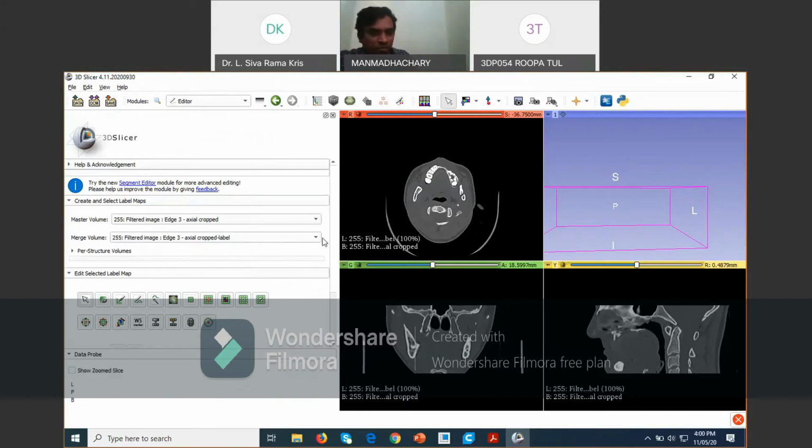Okay, I think all of you got this one up to now here. Any problem still now? Someone, Rahul Patel, is asking, please repeat the crop volume step. Oh my God. Okay, I will do one more time. Again, the same thing. I have explained it several times already. Otherwise, we'll be staying here only. We cannot complete.